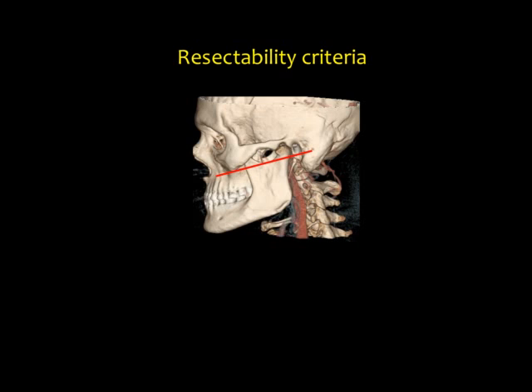Somebody the other day told me to do a reformat. Sometimes you have obliquity. You said it, na? It was a very good point. Because of the angle at which the acquisition was taken, you can see the mandibular notch at any level, but in the sagittal you cannot manipulate it. It cannot come higher or lower. So if you want to see exactly whether the disease is reaching above the mandibular notch or not, you should look at it on the sagittal. Everybody understood?